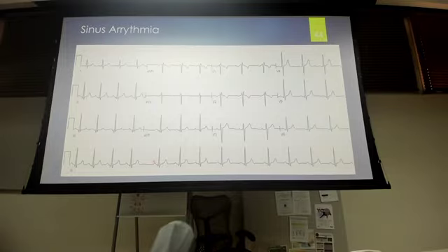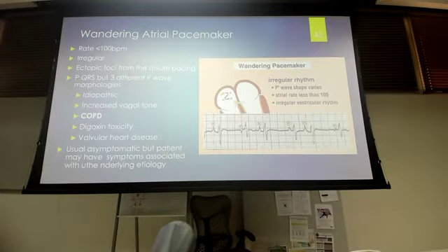And then you might have a beat that comes a little bit early, maybe half a box or so, maybe one small box. And it's all in association with their respiration. It's totally in association with their inspiration and their expiration. Nothing to do. Normal variant.